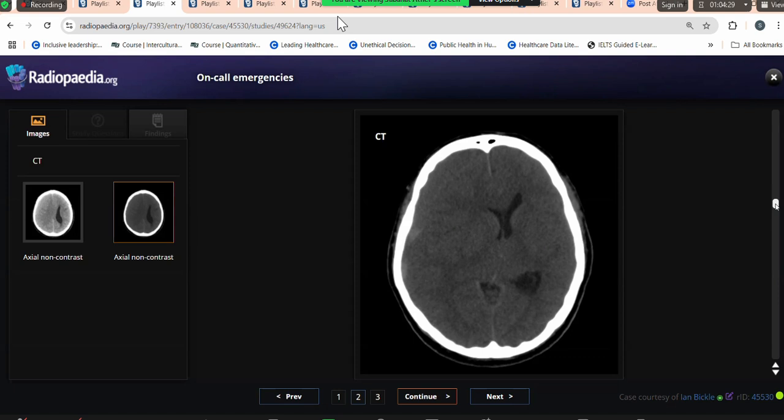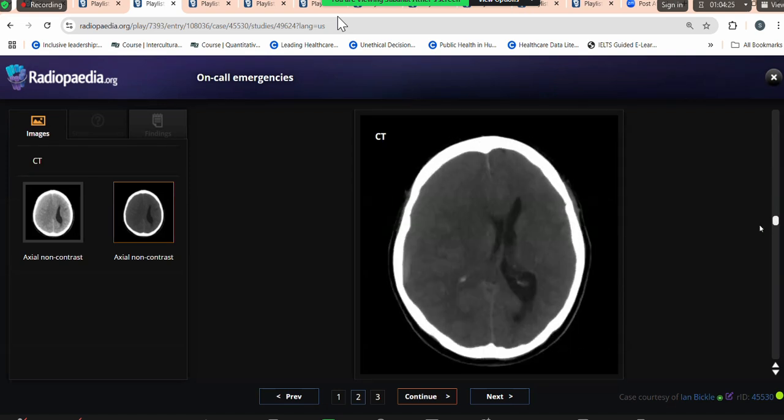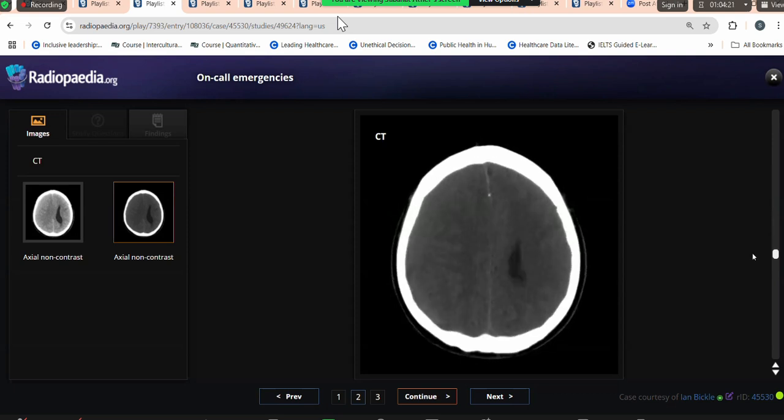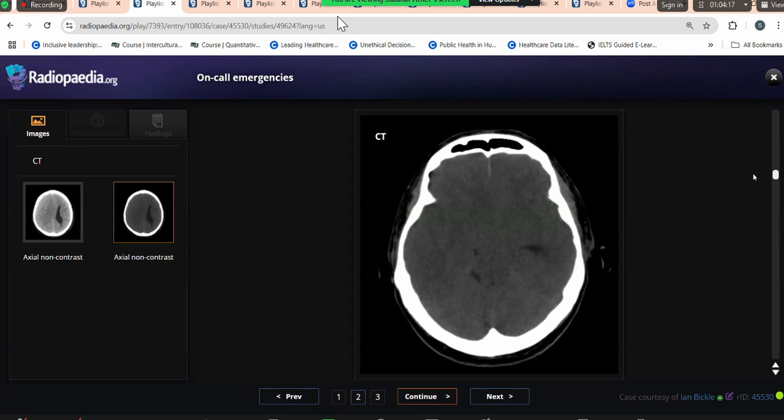So I can appreciate that there is a large significant subdural hematoma outlining the right frontal, parietal and temporal lobes and causing significant mass effect with subfalcine herniation. I would urgently inform the referring physician of my findings regarding this subdural hematoma which is causing herniation, review the clinical notes of the patient as well, and urgently involve the neurosurgical team for the evacuation of the subdural hematoma.